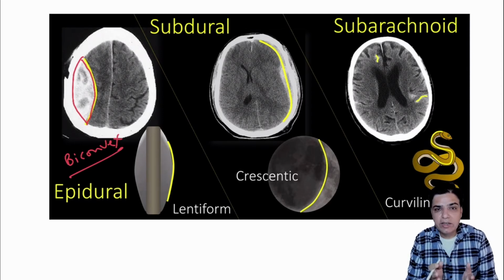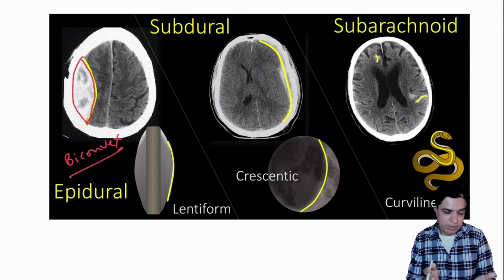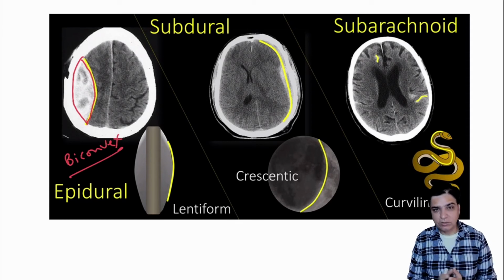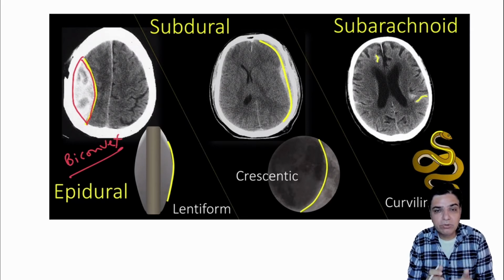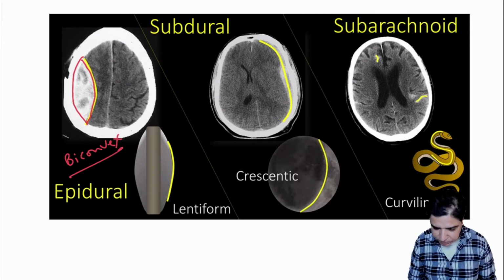So there's a clinical history of severe onset of unbearable headache, and maybe associated with high blood pressure, or the patient is on anticoagulants. Well, that clinical picture and this type of image on a CT scan would fit the bill, and you can say that this is most probably a subarachnoid hemorrhage. So remember, biconvex, extradural; crescentic, subdural; and serpentine, small serpentine here and there, extending where you would normally see black shadow. If you're seeing whitish shades going in there, probably that is subarachnoid hemorrhage.